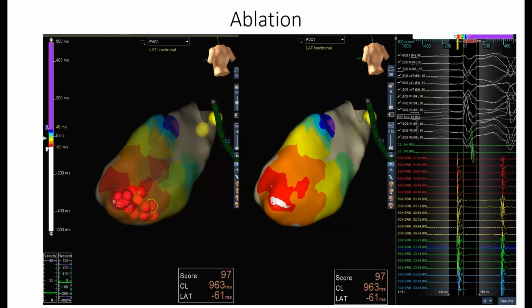Okay? It's important that you examine your map after the ablation. Think about why you see two early spots. So you chose to ablate the bigger area, the bottom one. You left that tiny white guy up there. I don't know whether, if you had ablated that small guy up there first, you might not have had to put in so many burns, maybe. That question still remains, okay?